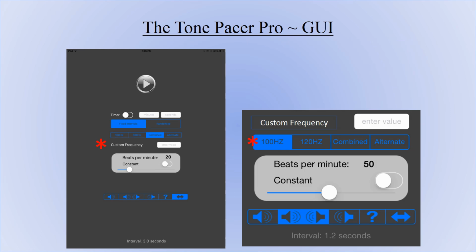The Tone Pacer Pro has a unique feature unavailable on the Tone Pacer original application. The Tone Pacer Pro allows you to set a custom frequency. This slide shows you how to do that. You see the label for custom frequency on the picture on the left hand side of the slide here. You see the red asterisk.